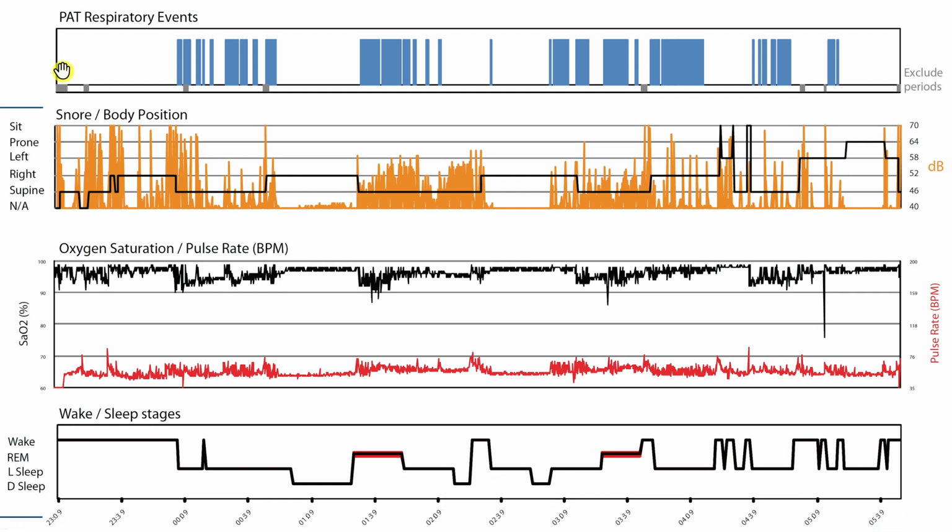So what you need to do is, when you see things on the graph up here, you have to go down to the bottom to see what time it was. So for example, here's an event. This blue bar represents an event, and it happened around 2:39 a.m. This isn't a super helpful graphic in my opinion. It's just a bunch of events clustered together.